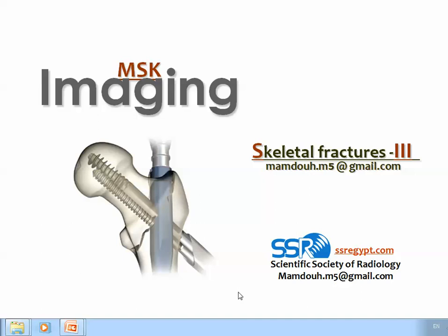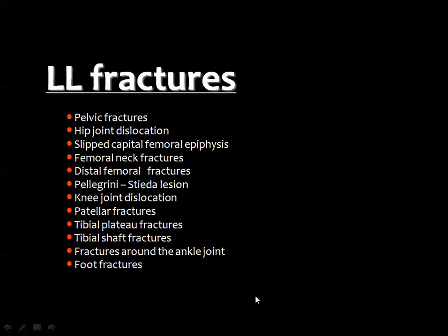Dear colleagues, we'll continue the lectures about skeletal fractures. We have finished the fractures of the upper limb, and now we are going to discuss the pelvic fractures as well as the lower limb fractures. And we will try to outline these topics. First, we'll deal with the types of fractures of the pelvic bones.